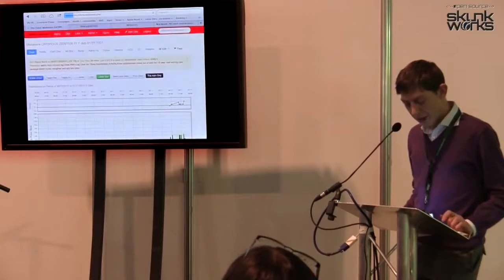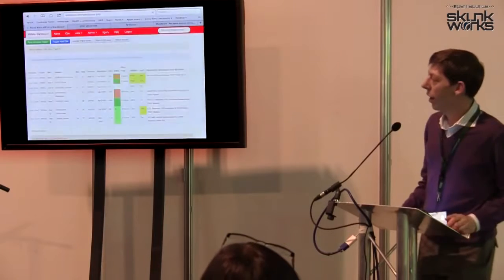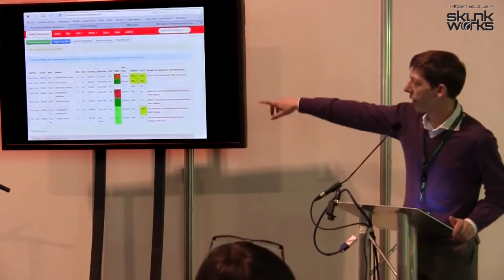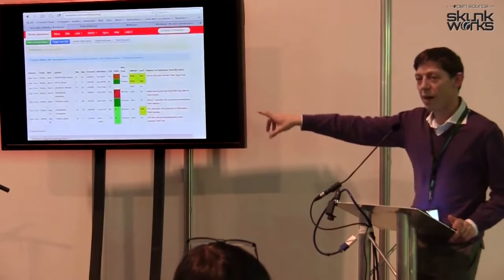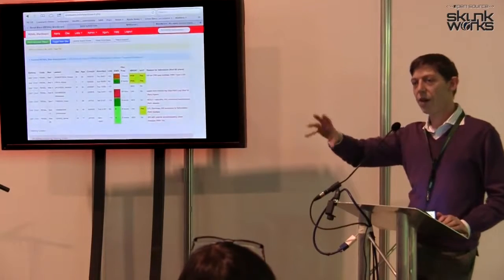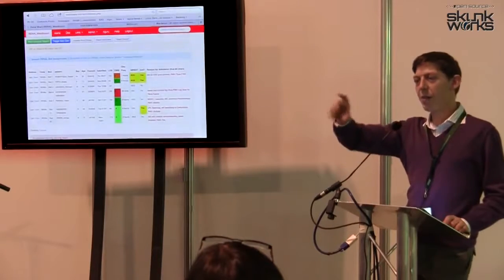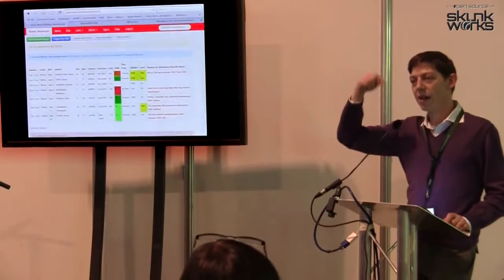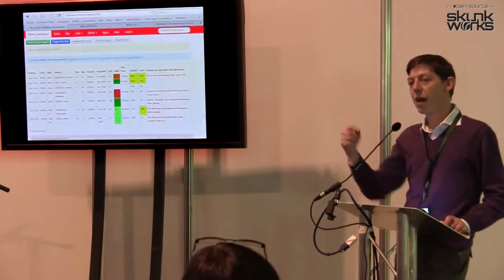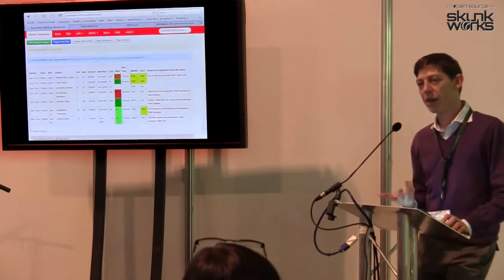So for hospital outreach people, can we get a whole-hospital view? Yes, we can. This is a single ward view, and you can see all the patients and the EWS. What we've been working on at Luton in their operations room is a whole trust view, sorted by early warning score. So the sickest patients are at the top of the list, and you can do a sort of real-time audit that people are doing their 30-minute observations, or are doing what they're supposed to be doing.